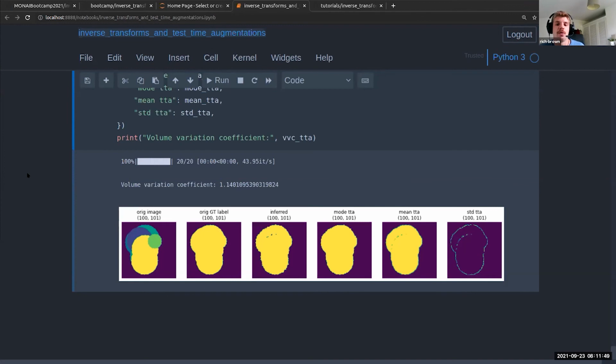So when it comes to deploying your model, say, if you're perfectly happy with it, as, for example, they do in Clara, you'll want to take your image and apply your basic transformations. So you've set up your model so that it deals with voxels of 2 millimeter. You're still then at deploy time or at test time going to want to downsample it to 2 millimeter. If afterwards you want to save it to file, that's when you would then be applying the inverse. So hopefully that makes sense.